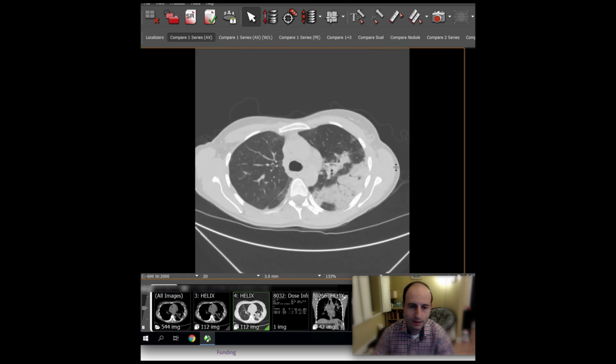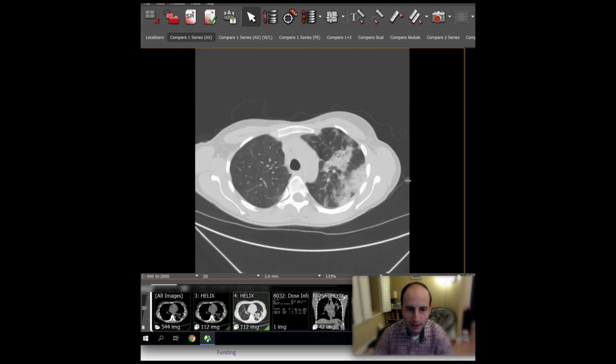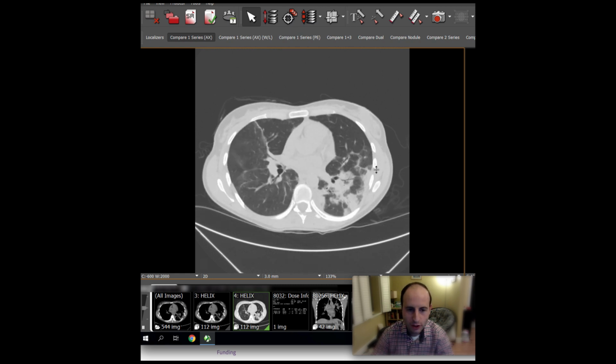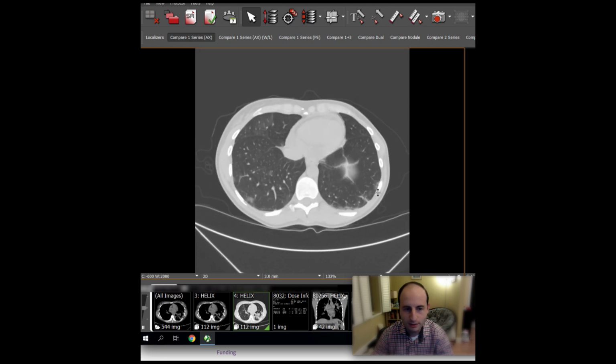But again, you could imagine, depending on the extent of COVID disease in your catchment area, if a patient presented with fever and had this appearance, even though these consolidations are denser than the quote-unquote typical COVID description, would someone suggest COVID infection for this kind of appearance? But again, this is eosinophilic pneumonia, not an infection at all.